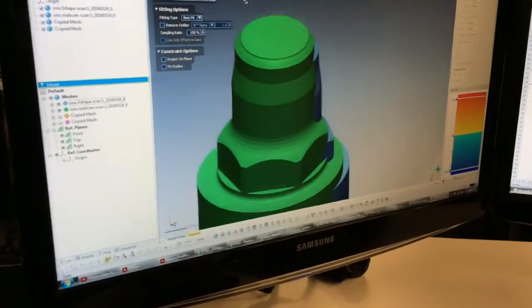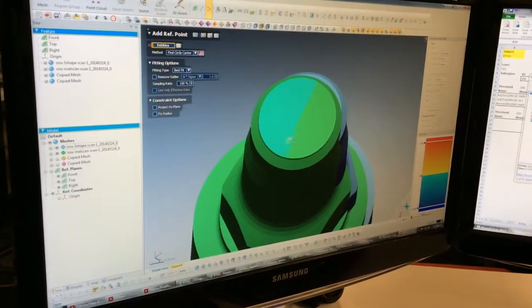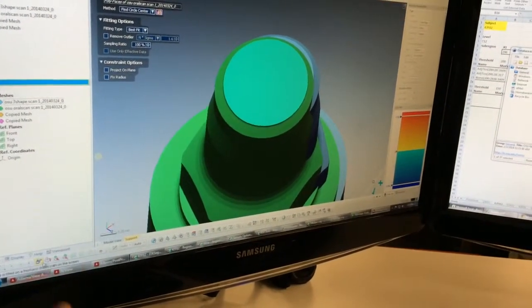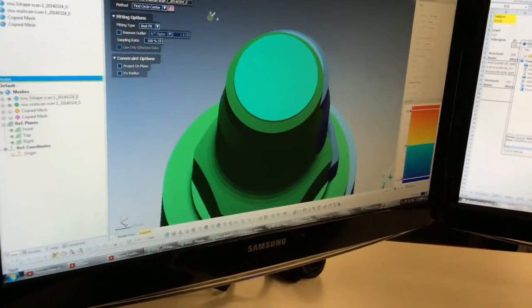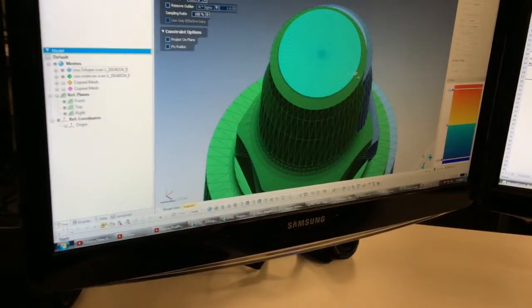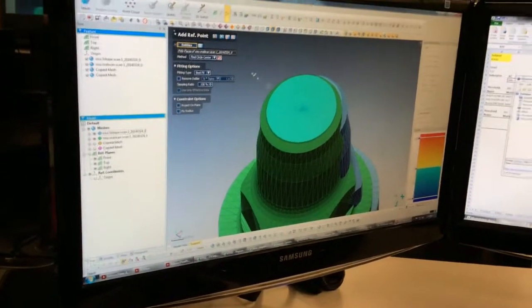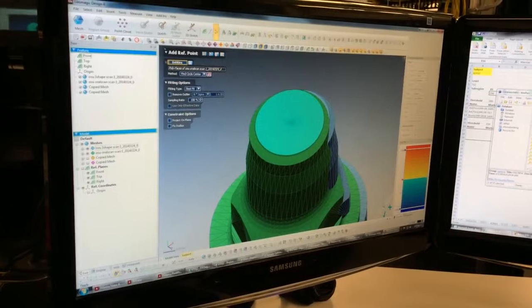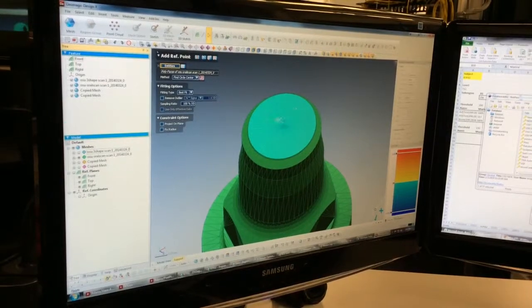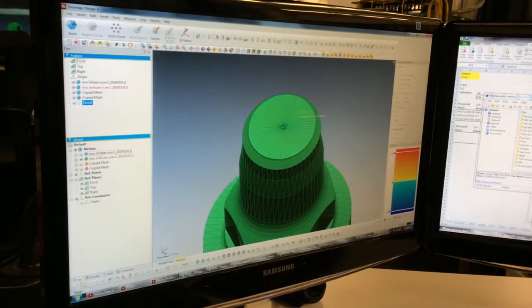Now, if we want to find circle center, because again this is CAD, it's easy enough. I'm in the paintbrush mode, and it's just as simple as select all of them. If it's helpful, you can switch to different shading modes if it's easier to see the edges. After you've selected all these, it'll show up that there are polyfaces of that one in here. Make sure that you are only selecting stuff on your one model. What you see is what you get. Then you hit the check, and boom, you have a point.